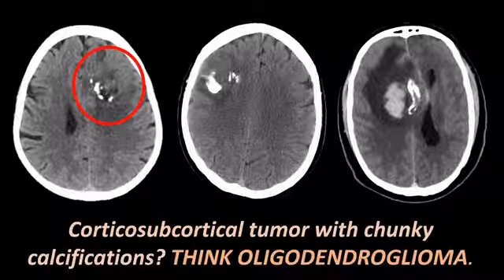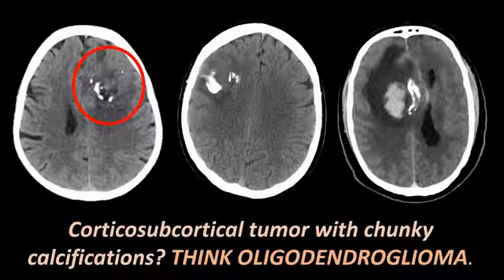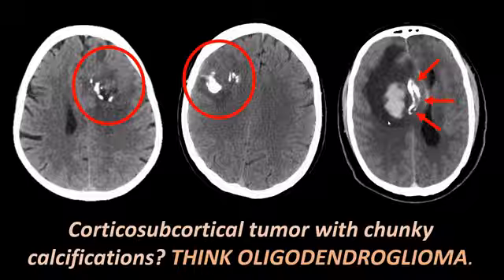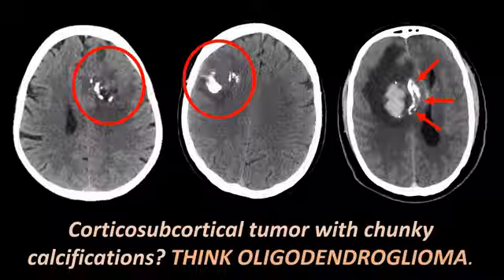Here we see some other examples of pathologically proven oligodendrogliomas, and in these patients the diagnosis was each and every time suggested on the unenhanced CT of the brain. We see here a cluster of chunky calcifications and some distortion of the brain parenchyma over here. This tumor we've seen on the previous slide, and also a typical, well, not typical, but also not infrequent, oligodendrogliomas have very fragile chicken wire capillaries, so they are prone to rupture these capillaries, and oligodendrogliomas can present with hemorrhage.